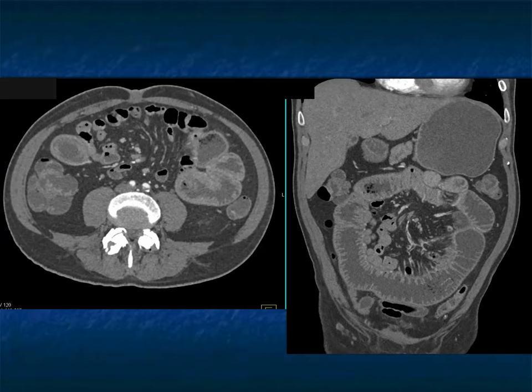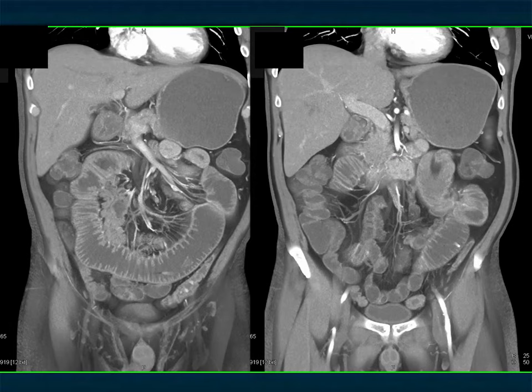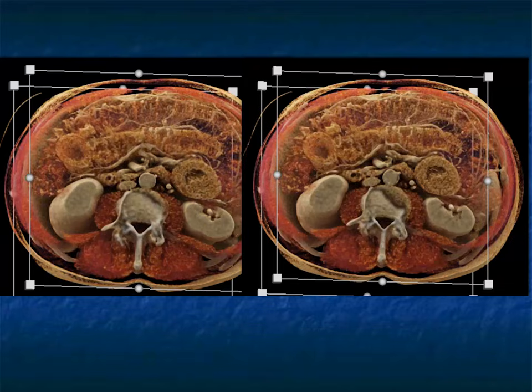you've got to think about tumor. You've got to think about lymphoma. But here, just a really nice example. There's the intussusception. What could it be? It could be a range of possibilities. I don't see any adenopathy. I don't see any other tumors. The liver looks okay. I don't see the spleen. But this was an intussusception.